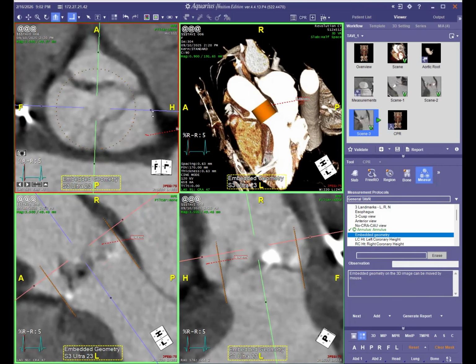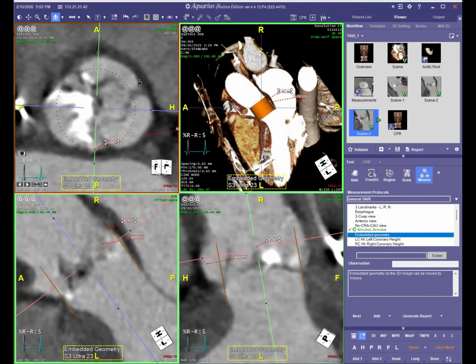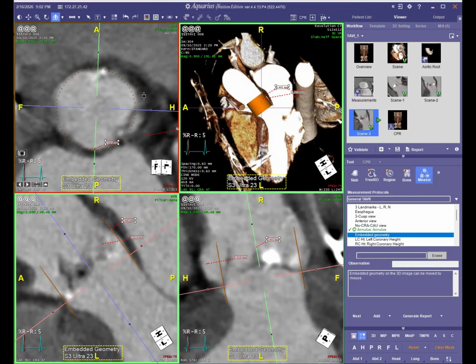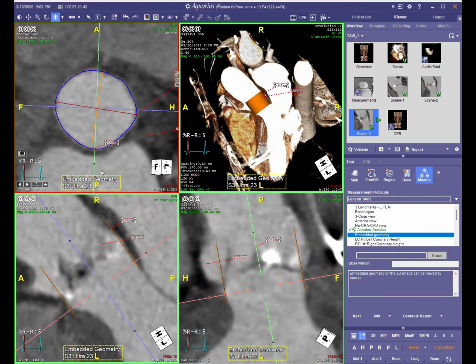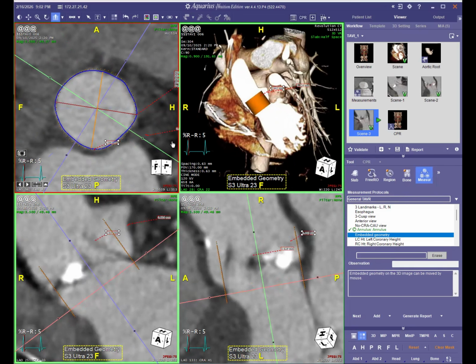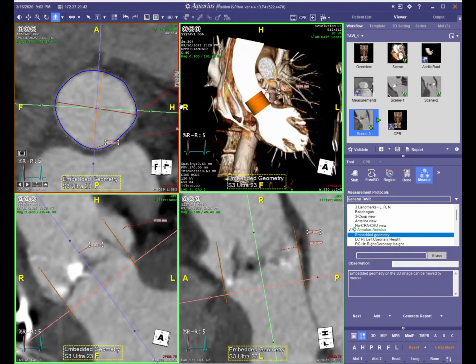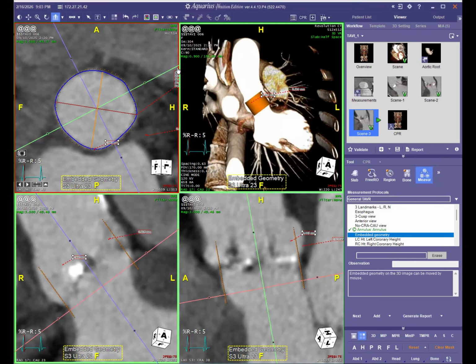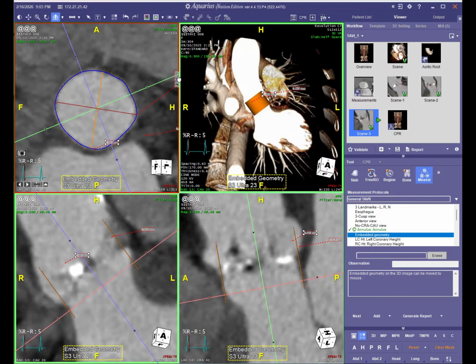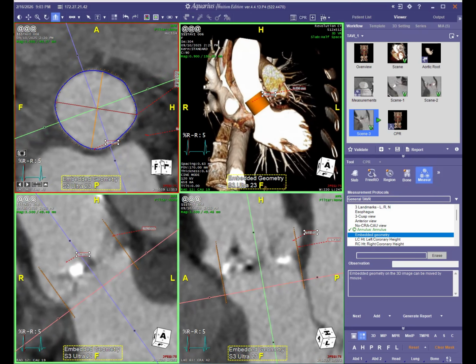I'm also going to leave a line segment 3D straight marker at this point, making sure that line is sort of parallel to the pink, so there's no ambiguity when I'm looking at it again. I'm going to scroll back down to the virtual basal annular ring plane. I'm going to rotate around, going back through my left main ostium, over to the left-right commissure. This being a bicuspid valve, the left-right commissure is going to be pretty low. And it's this thick black tissue over here.